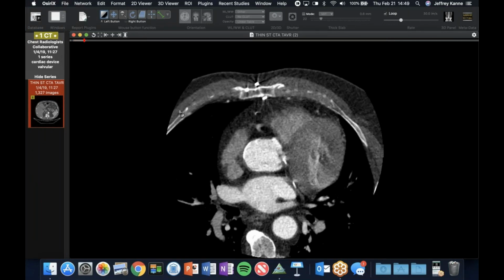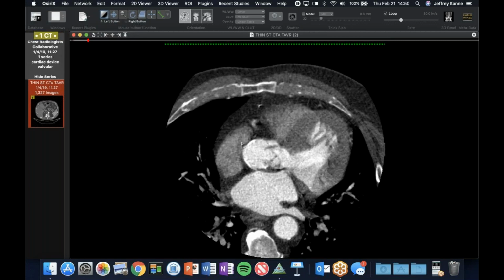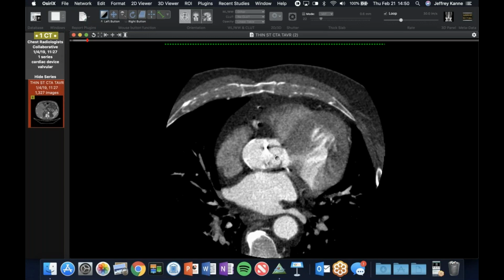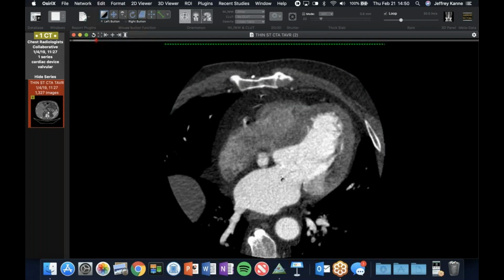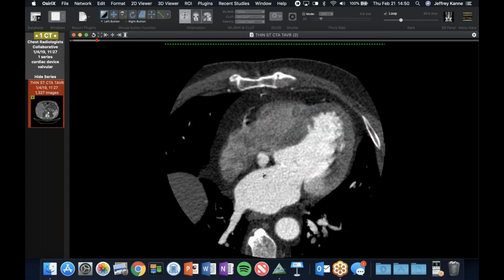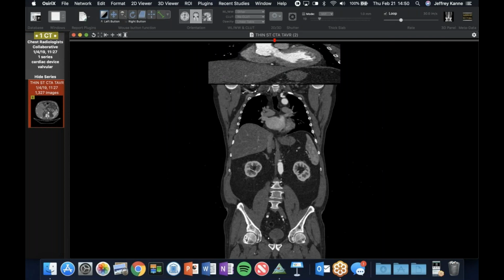As my colleague was looking at this case, talking about the aortic valve, this is a patient who already has a valve prosthesis in. I'll change the plane, but you'll first notice the little struts of the valve, but the base of the valve has a funny orientation. But then as you scroll down, you realize there's a little collection down here that doesn't belong. So if I do a coronal, I should run this pretty quickly, you'll see that actually this is another example.